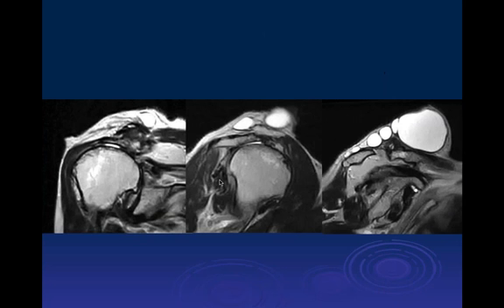and not bony. Okay. Well, sure. The supraspinatus muscle. What about the muscle? She's got a good muscle. That's right. That's huge. Yeah. For a female, I don't know how old is she? She was, I forgot her age, but she was not young. But yeah, you're right. Weightlifter.